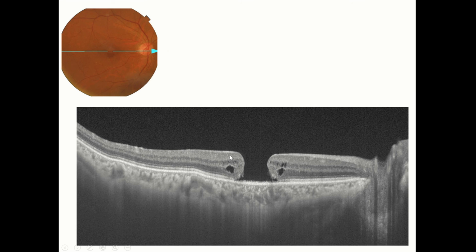This is a patient with a full thickness macular hole on the colored fundus photograph, and this is a large hole, probably more than 400 microns, and you cannot see the posterior vitreous attached to it, so it looks like a grade 4 macular hole. So you would say this is a patient in which there is deficient retina in a circular pattern in the foveal area, and there's thickening or rolled edges of the retina surrounding it with some intraretinal fluid, which is typically the cuff of fluid which this area of the retina imbibes.